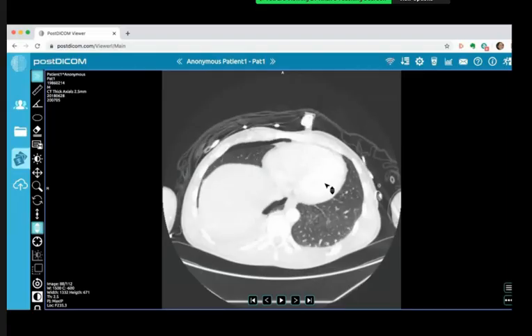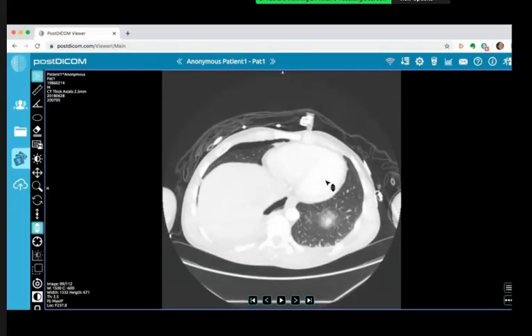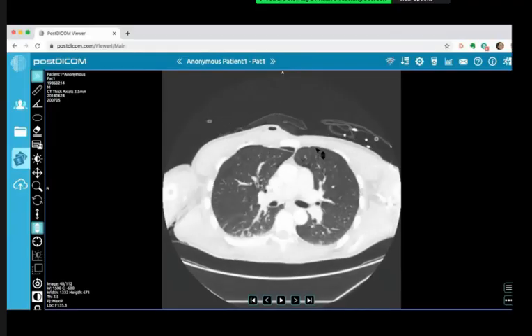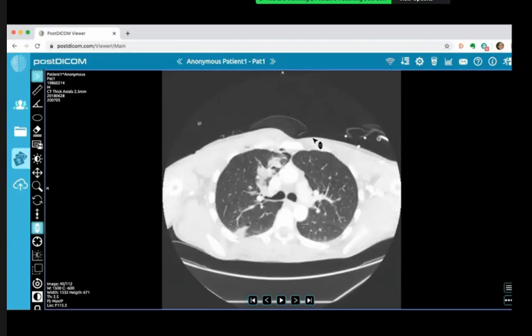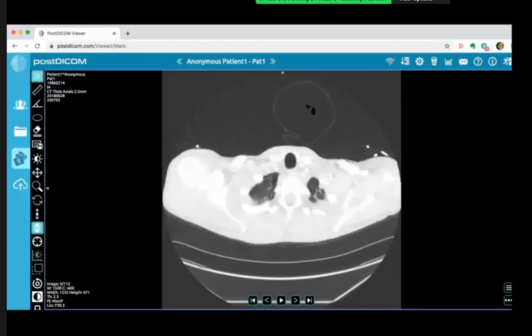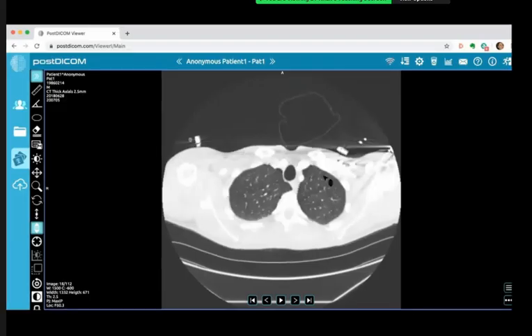I'll look for any pericardial effusion in the soft tissue window, and look for any other. Actually, I thought I saw a small pneumothorax on the left as well. But I think it's probably just a subpleural bleb or something. I don't see any obvious tracheal injury, but I can't exclude a bronchial injury in the mid section of the CT itself.